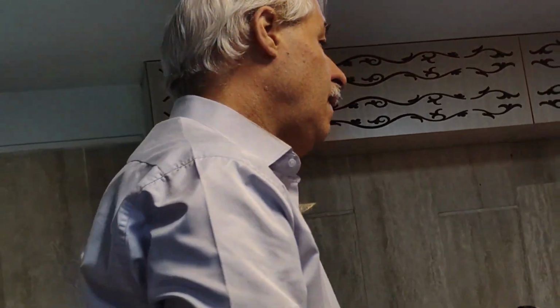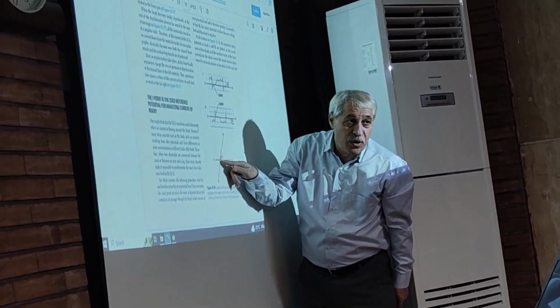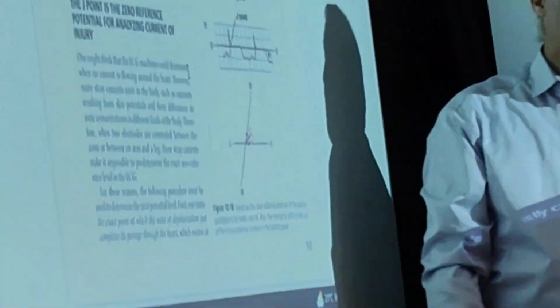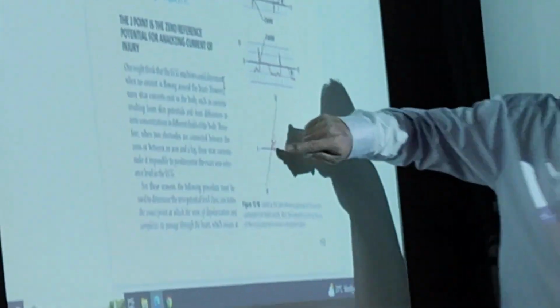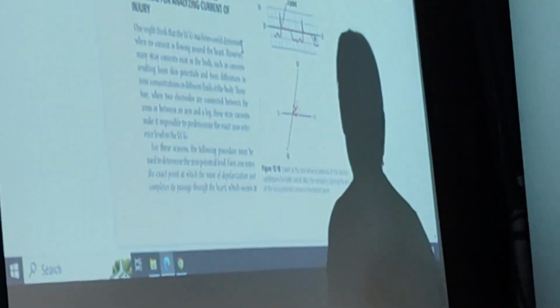The positive end of the resultant vector is directed to the positive part. The initiation of the resultant vector, this is the starting point, is directed to the negative part, which is always depolarized in an infarcted part. Which part is infarcted now? Posterolateral wall of the right ventricle. Did you get it?